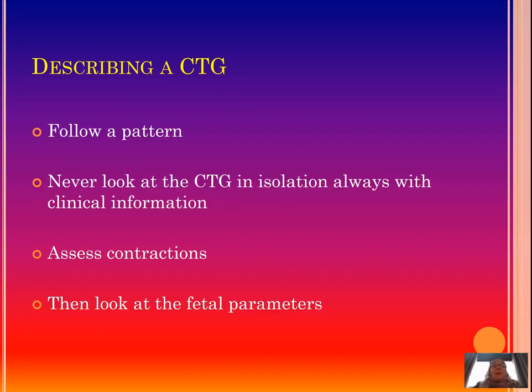So when you interpret a CTG, it is really important to follow a pattern. This is important because otherwise you are likely and prone to overlook important details. Therefore, you should always follow a pattern which will allow you to look at all of the important features that a CTG displays.